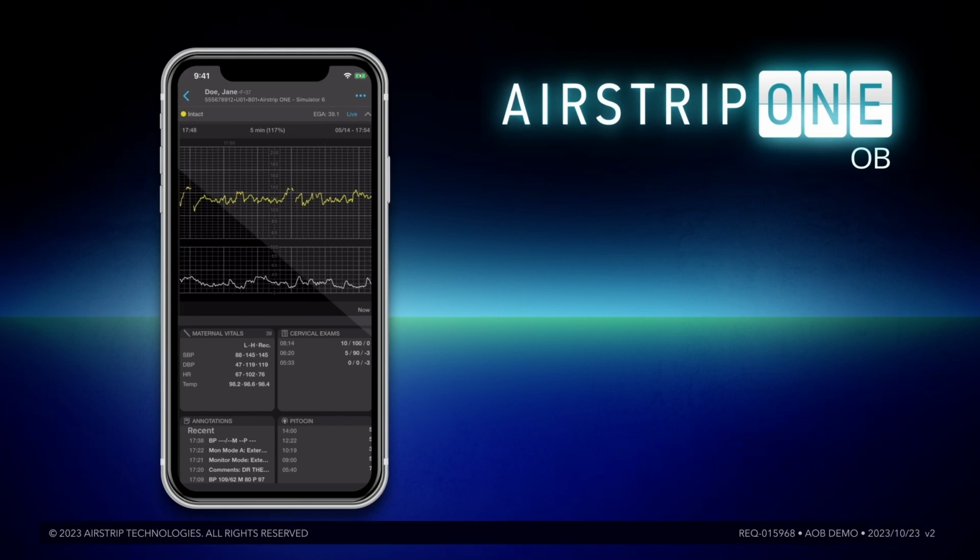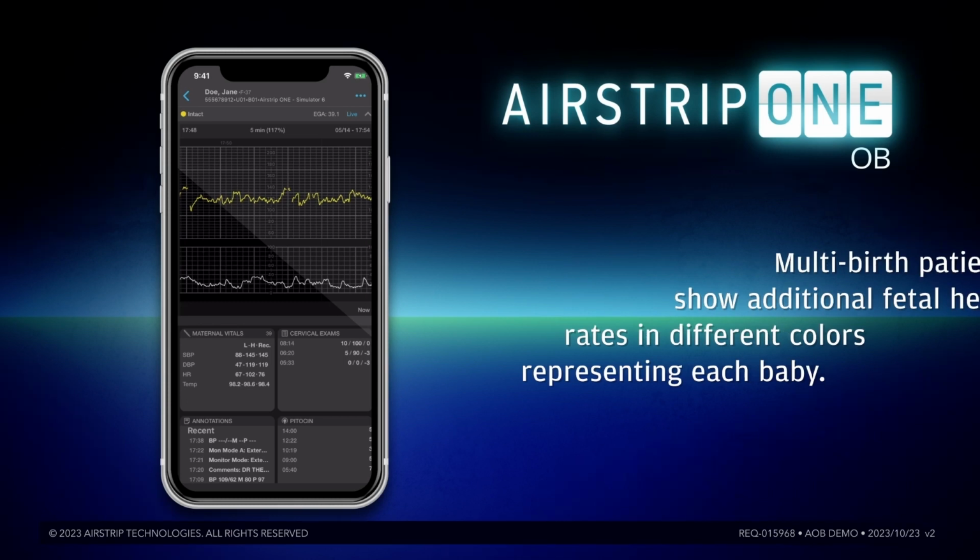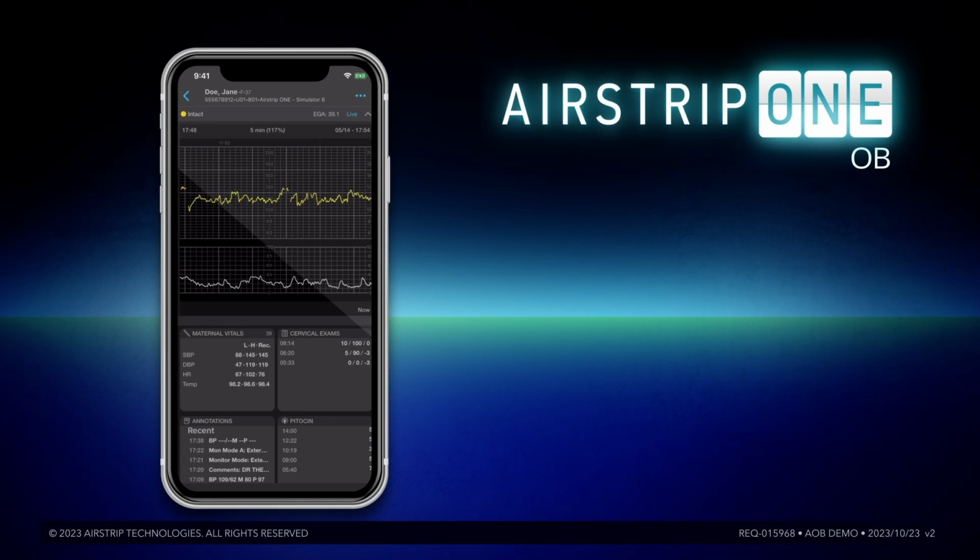If this was a multiple birth patient, there would be multiple fetal heart rate waveforms, represented in different colors for each baby. If the mother was also on a monitor, her heart rate would be represented on the grid with a purple waveform.